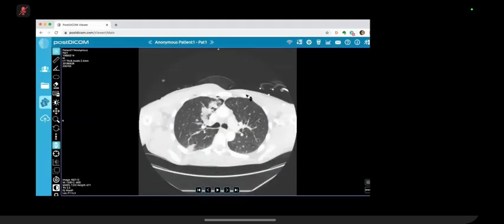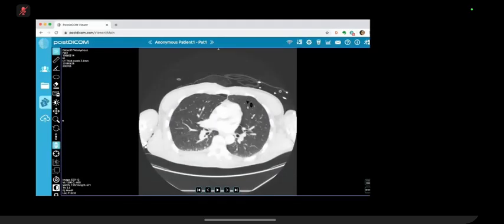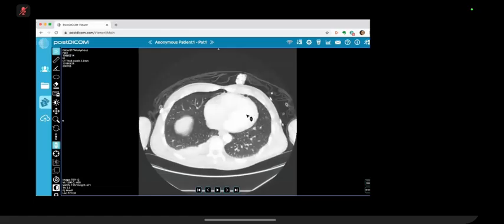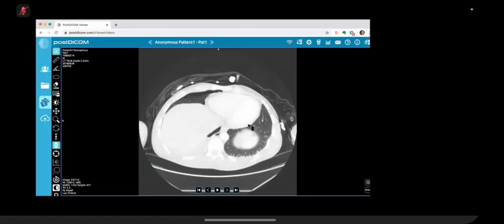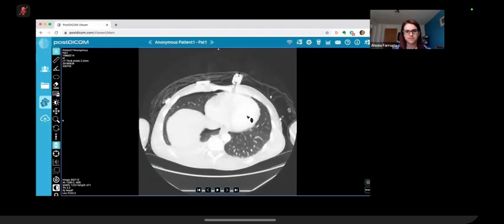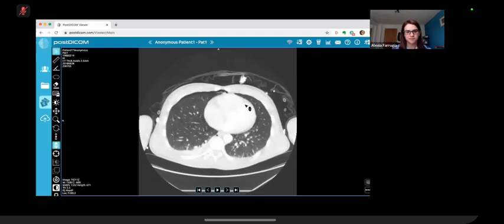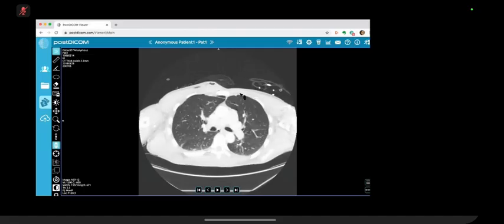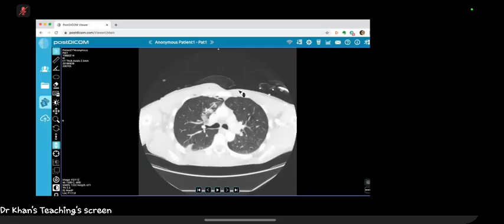I'll be concerned about injuries to either the large vessels, specifically the aortic arch, and the heart itself. I'll look for any pericardial effusion in the soft tissue window, and look for any other. Actually, I thought I saw a small pneumothorax on the right as well, but sorry, on the left.